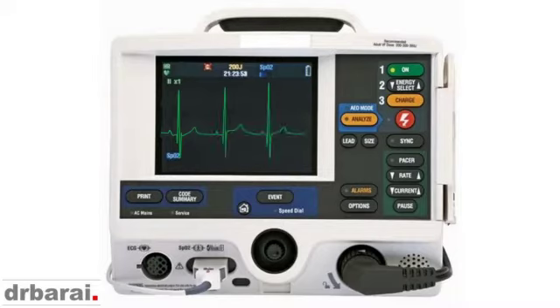This is a 17-year-old chap who was playing footy or football and has got a collapse. But when he came to us, he has got a GCS of 15. He had got a similar collapse in the past, did not have any previous ECG or echocardiogram, and this is what we found when the patient was brought into the resuscitation cubicle. What you can see obviously is the QRS complexes are extremely narrow, and this is sinus rhythm. There is a P wave followed by a QRS complex, P wave followed by a QRS complex, which is great.